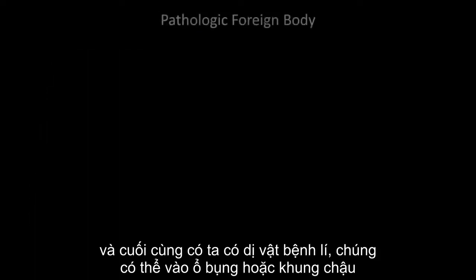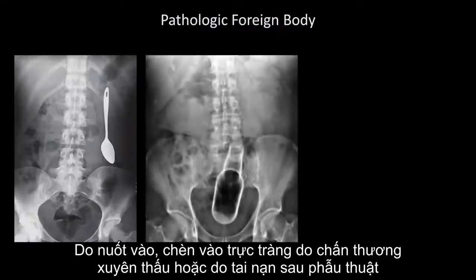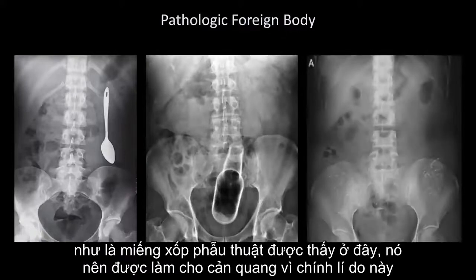And finally, we have pathologic foreign bodies. Pathologic foreign bodies can get into the abdomen and pelvis either by ingestion, rectal insertion, from penetrating abdominal trauma, or from something being accidentally left behind during a surgery, such as surgical sponges shown here, which should be made to be radiopaque for this exact reason.